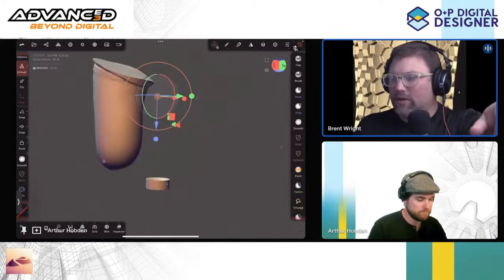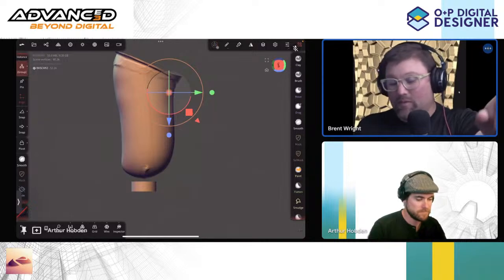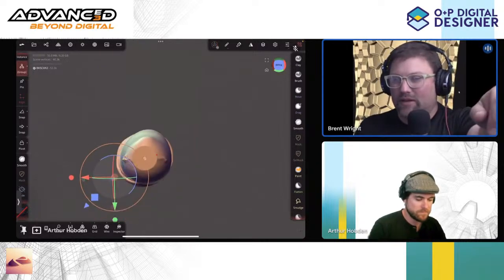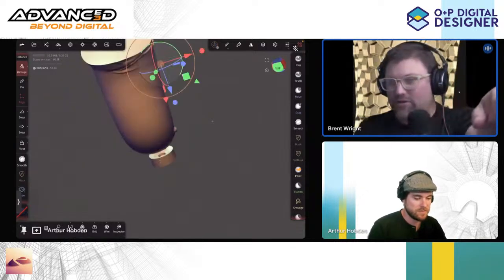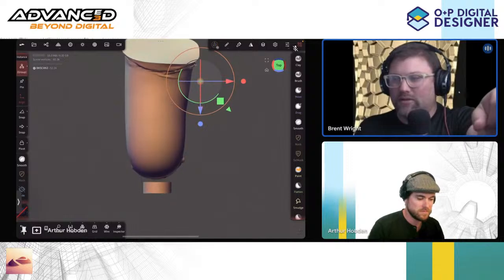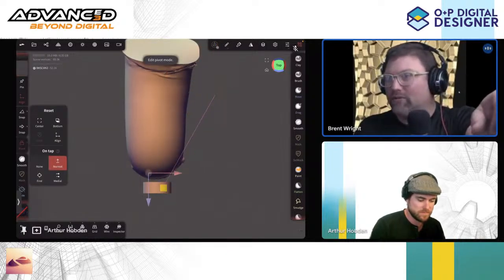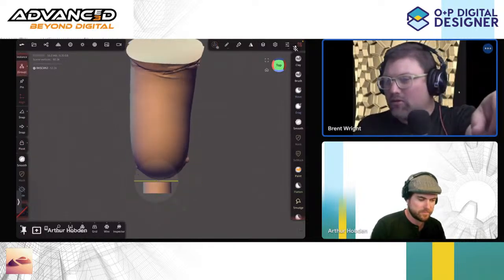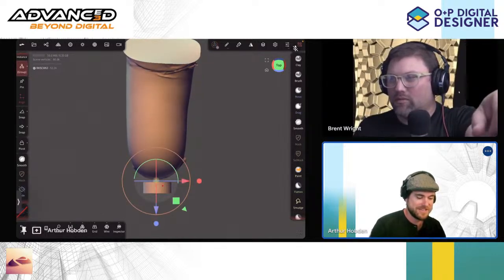It's probably just me, but I prefer aligning from the backside first, so it allows me to take a look at the hamstrings and the line of progression. Then I flip around to the anterior to get my rotation, and then I'll flip medial lateral for flexion extension.